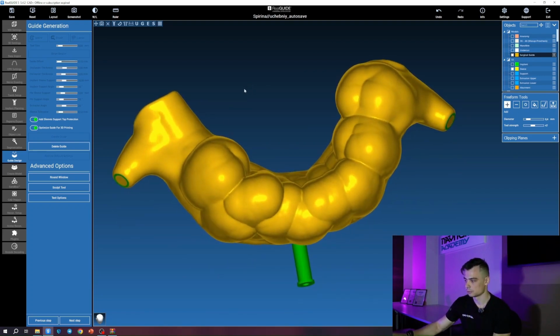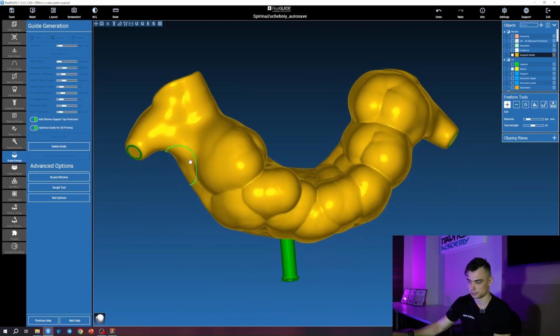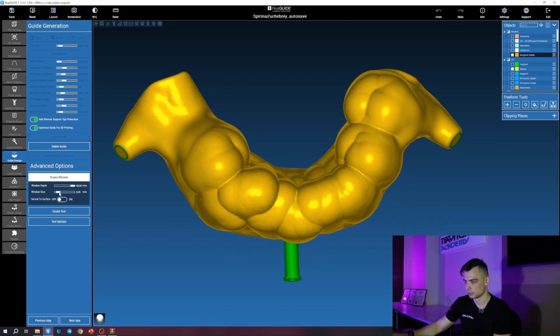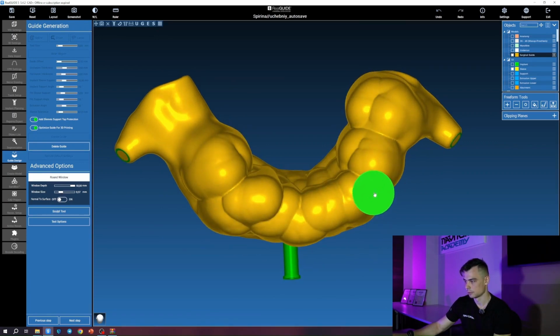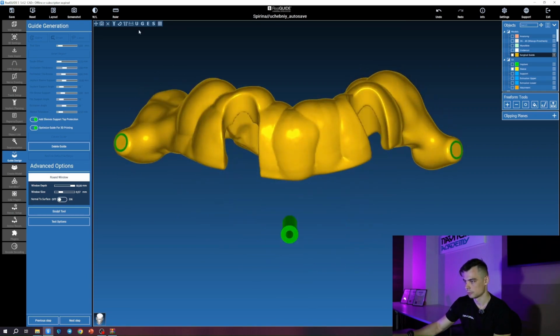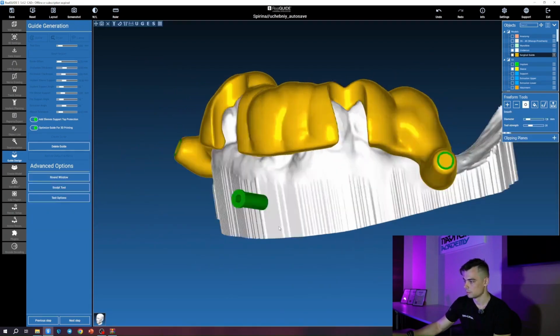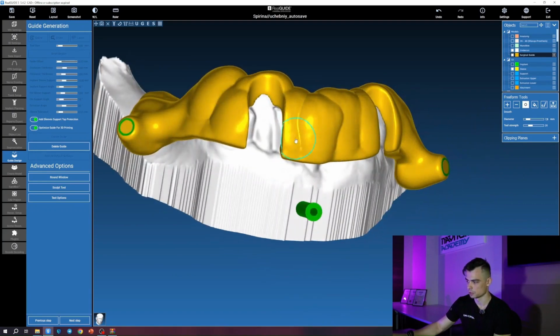And also, since the template is tooth supported, the golden rule applies. If the template is tooth supported, you need windows for seating. We make these windows approximately 8 or 9 millimeters in size, in diameter. We make 1, we make 2. These protruding edges can also be smoothed out a little.